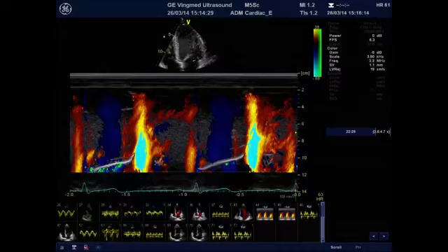Again, this parameter, the Vp, in this case 65, can be used in combination with the mitral E wave. If someone combines a parameter related to both filling pressures and relaxation with one which is mainly related to relaxation, the effect of relaxation cancels out, and we have a ratio called E over Vp, which should be related directly with filling pressures.